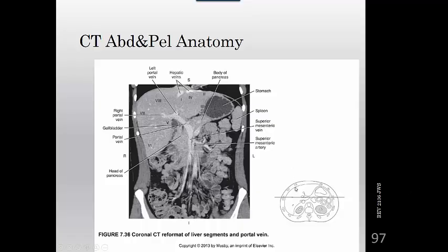And this slice is taken through this midsection here. So we're going through coronals from front to back or back to front, but we're going in this direction. And this slice is not exactly mid-axillary, it's more anterior in location.